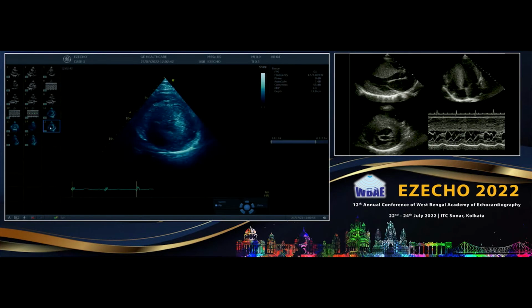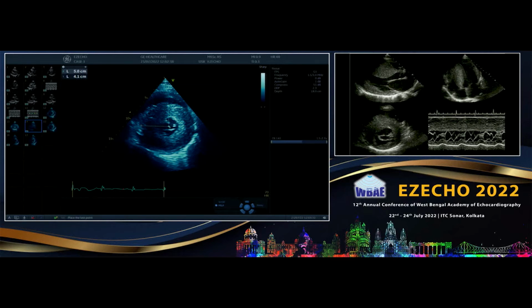Then how do you, no one knows how exactly to take the thickness. So generally, you can stop it in mid diastole. Now what generally do you do, just this is the cavity, just take a midpoint of that cavity, and from that midpoint of the cavity, just go radially, correct? Just come to the center of the LV cavity. From there, just go to the epicardium. You know that this is the radius, and on this radius, you now measure the thickness, so that you don't measure it in the oblique direction, correct?